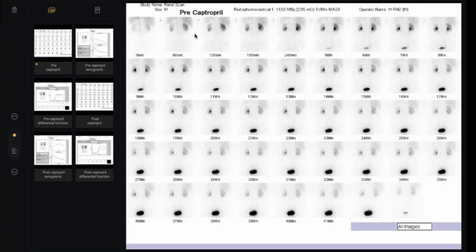This is right. Doctor, one by one. Tell me what happened. Firstly, in the first images at the upper left, I can see that there is decreased perfusion in the left kidney and there is normal perfusion at the right kidney, but there is an excretion and contrast uptake seen in the renal pelvis, and both ureters are seen in the last image in the first row.